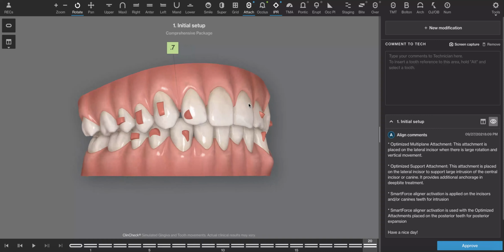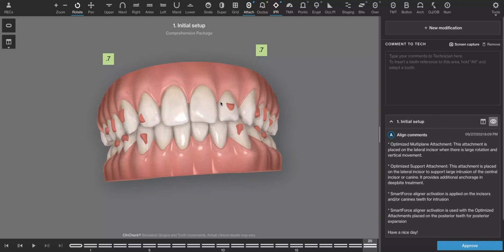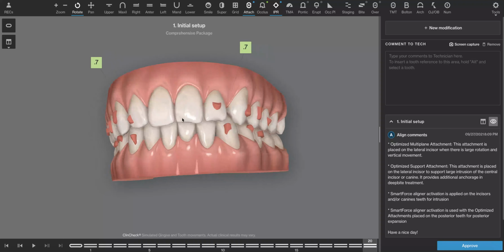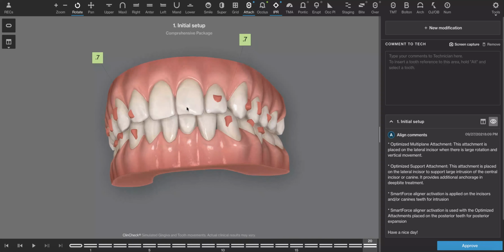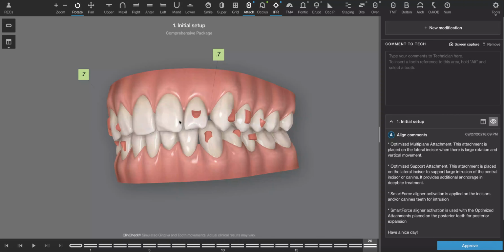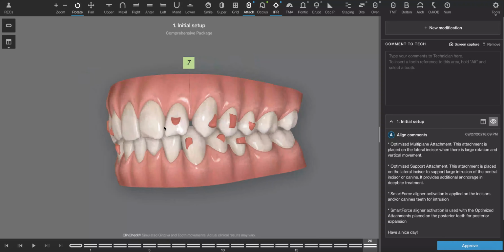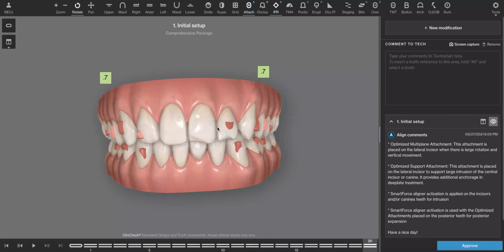This is a pretty straightforward case. Many cases don't lend themselves to being this straightforward. So you can see where IPR is an easy solution, although I'll make the case that doing IPR well is very hard. It's very easy to create ditching in the teeth that can cause a higher risk for caries long term. But that's a topic for another day. Here, it's a pretty easy decision. Just expand everything, get everything aligned, create some restorative space, and then slap some composite in here and call it a day. I think the patient would be more than happy.